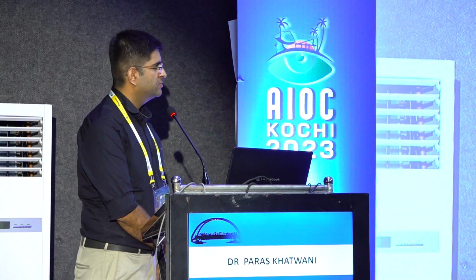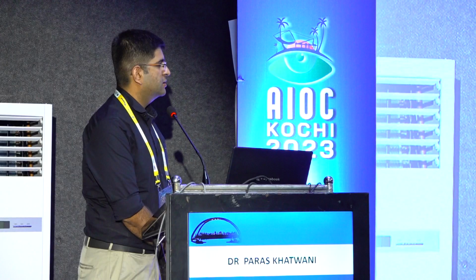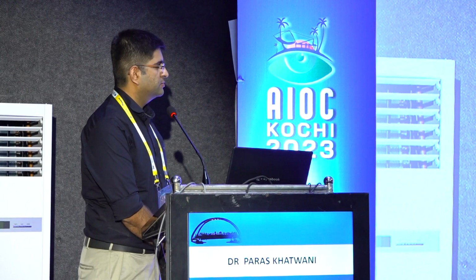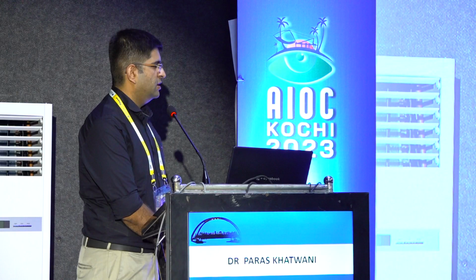Okay. What equipment have you used to take the MCI image? Spectralis machine, Heidelberg Spectralis. Okay, that gives all that. Yes, ma'am. So an OCT scan with the MCI. The MCI OCT can be constructed into a 3D image, so you can reconstruct the 3D images on that.